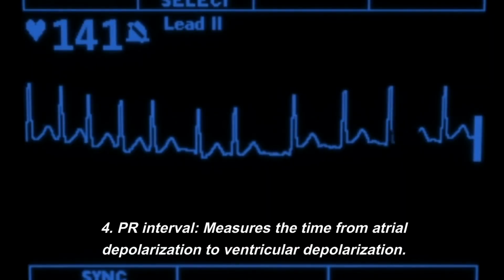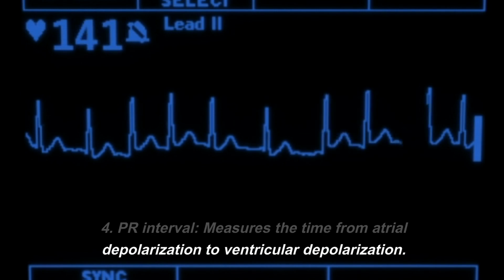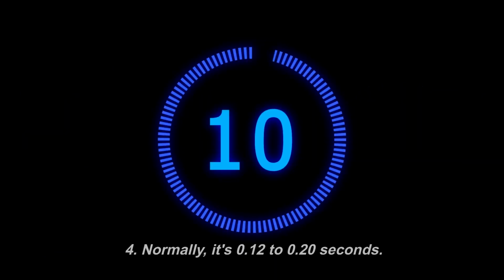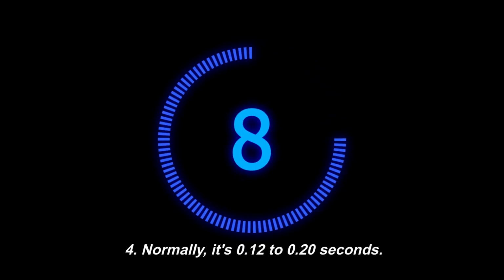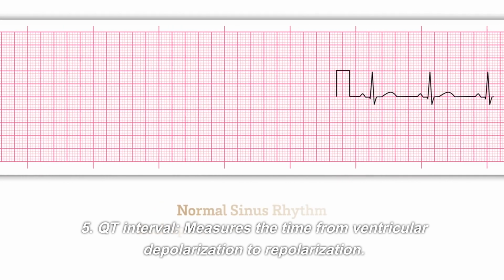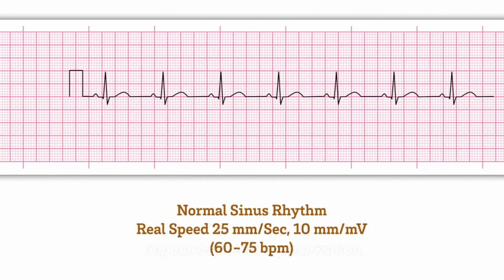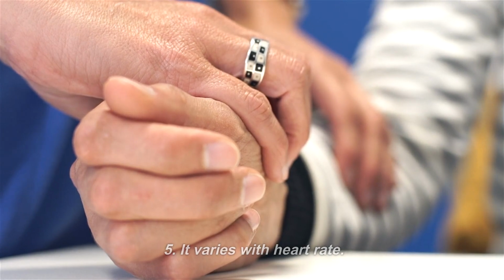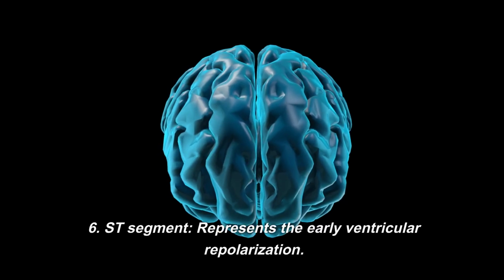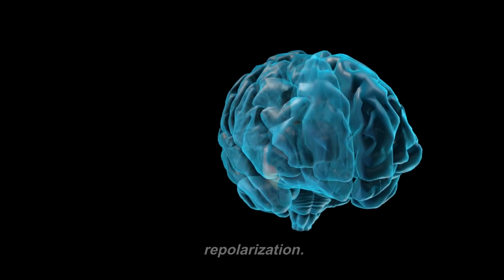4. PR interval, measures the time from atrial depolarization to ventricular depolarization. Normally, it's 0.12 to 0.20 seconds. 5. QT interval, measures the time from ventricular depolarization to repolarization. It varies with heart rate. 6. ST segment, represents the early ventricular repolarization.